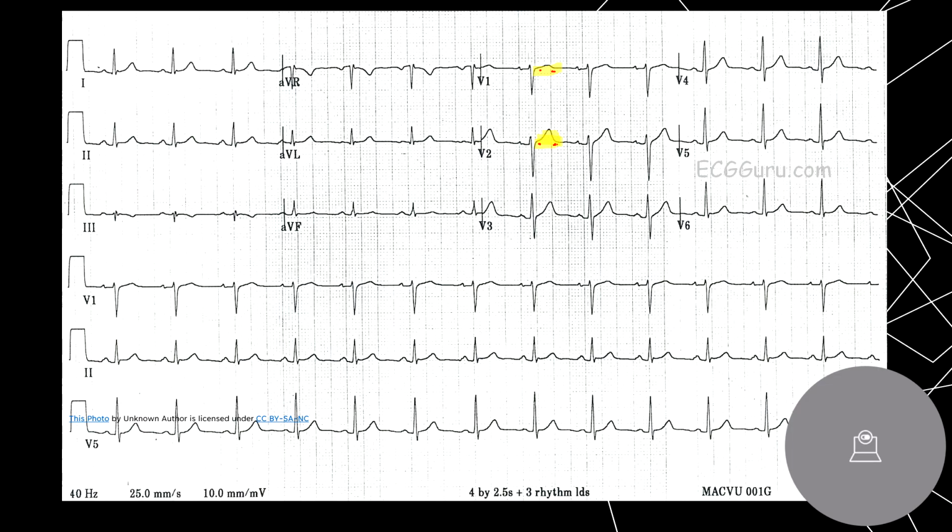V3, so you go to anterior. That's septal, and we'll go to anterior. It's V3 and V4. Again, pretty flat, no big deal. V5, V6, I'll highlight them just so you can see. Pretty flat, no big deal. So V5 and V6, remember, is going to be low lateral. Now we'll check out high lateral. Come up here. So pretty flat, no big deal. That's one. Let's look at AVL. Okay, pretty flat, no big deal.